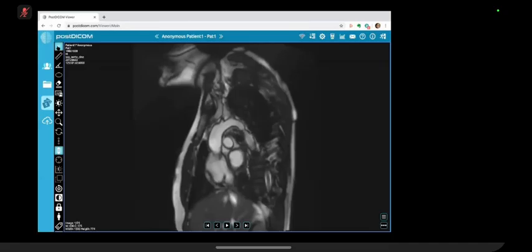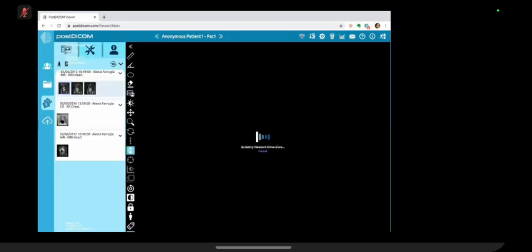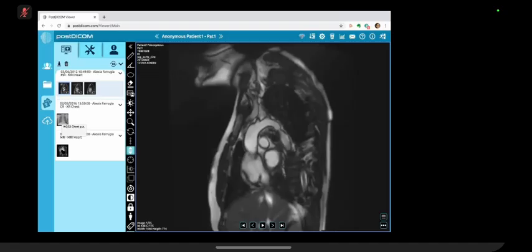Patient would need blood pressure measurement in left and right side of the arm, and upper and lower extremity distribution as well, to check whether there is a discrepancy in the blood pressure. Ideally, since it's a young patient, that's why I think probably we went for MRI and not for CT angiogram. Yes. But this is quite suggestive of a coarctation of aorta.